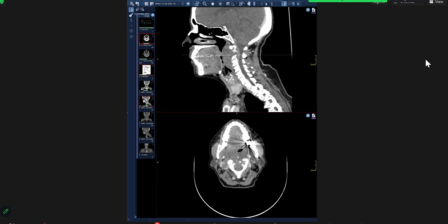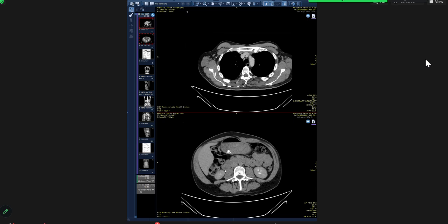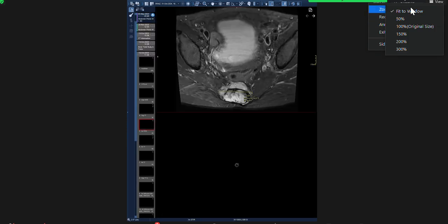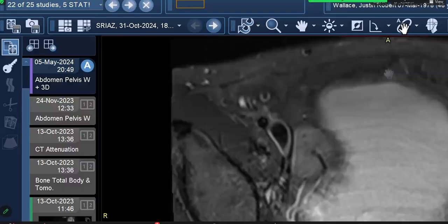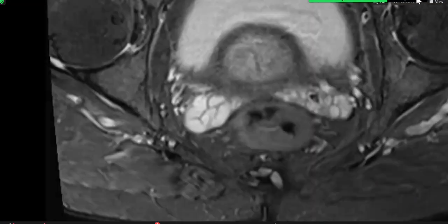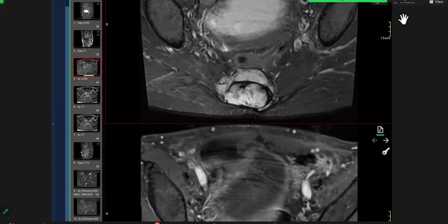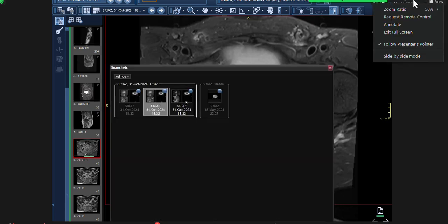So I'm going to show you a companion case here, because one pathology of one kind is okay. I don't want to show too many pathologies of the same kind. So I'm just going to show you this. I put a companion case for you here. So this is the MR of a sacrococcygeal chordoma, basically. So let's see.